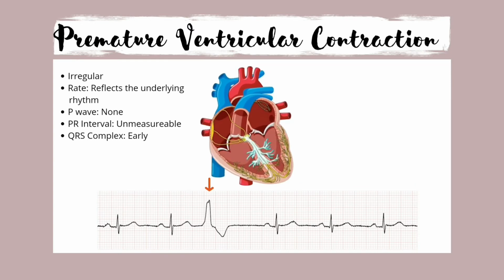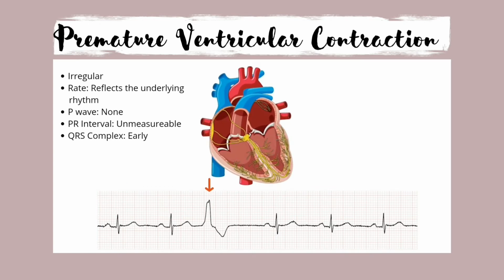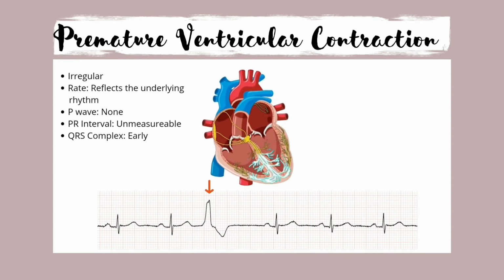A premature ventricular contraction (PVC) is a common event where the heartbeat is initiated by Purkinje fibers in the ventricles rather than by the sinoatrial node. PVCs may cause no symptoms or may be perceived as a skipped beat, or felt as palpitations in the chest. PVCs do not usually pose any danger.